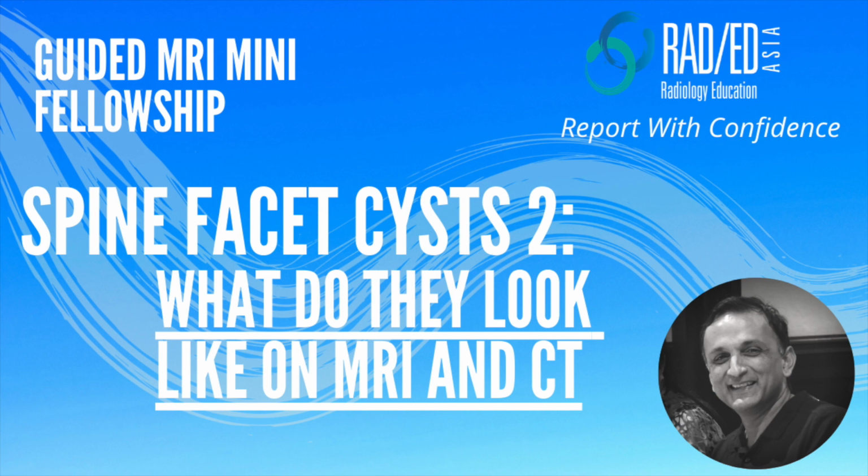Okay, welcome back. We are looking at spine facet cysts again. This is the second part in a series. We had the initial one last week where we looked at the important anatomy that's related to facet joints and what happens when you get a cyst, the involvement of adjacent nerves. In this one, we're going to be looking at the CT and MRI appearance of facet cysts and what the typical look of them is like on imaging.